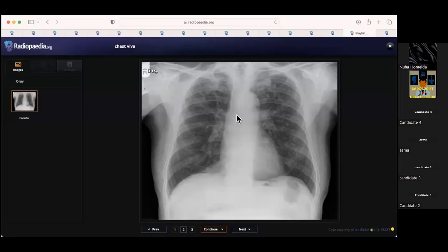Okay, so there is no evidence of lymph nodes here. No, bilateral symmetrical. Yes, it's always the last option when you say it, it's the diagnosis. What else can cause bilateral apical fibrosis? Conglomerate apical fibrosis with volume loss with no evidence of lymphadenopathy. It could be due to infection, pneumocystis carinii, maybe TB. Okay, so TB would be a valid option.